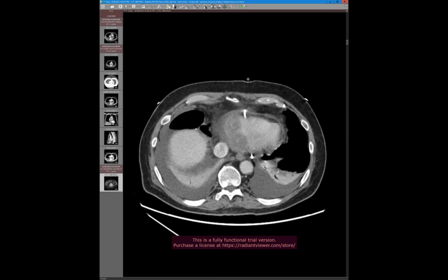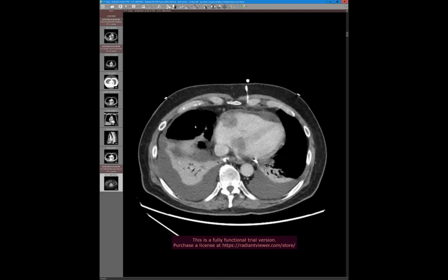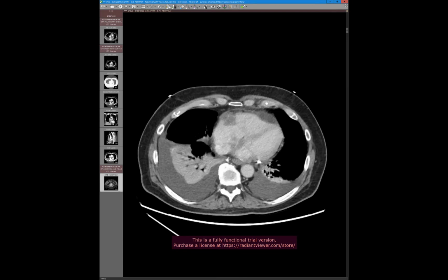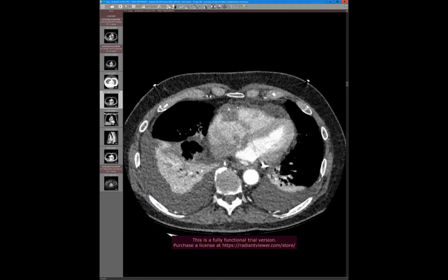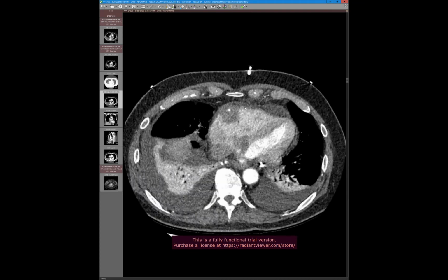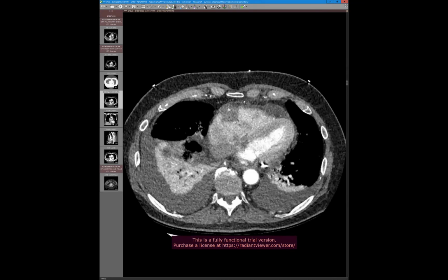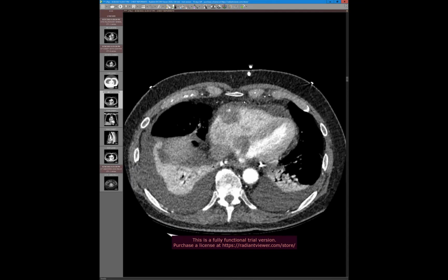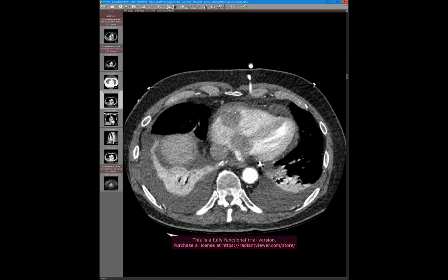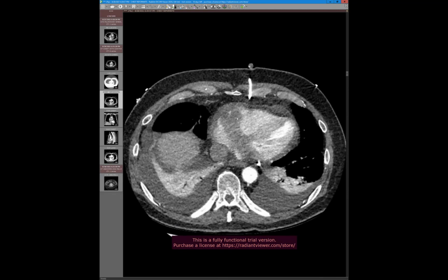What about angiosarcoma enhancement? Is that helpful diagnostically? Do they enhance, the vascular tumors? Yes, absolutely. So on a portal venous phase, let alone an arterial phase, you would expect this to be much more avidly enhancing if it was angiosarcoma. So that is a good point. I do have a couple of cases of lymphomas that are, for some reason, unbeknownst to me, avidly enhancing and have fooled me. But nonetheless, you're right. Angiosarcomas would be much more avidly enhancing, which would help differentiate it from lymphoma.